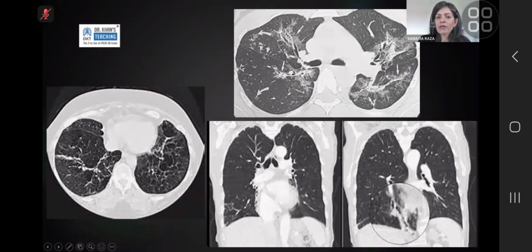So the reason for putting down active changes is the patient still gets treatment. Sometimes, particularly with COVID infections or atypical infection, they can get a bout of steroids, and that can really help improve their symptoms as well as their imaging. And the other factor to look for, obviously, in somebody, this is actually sarcoidosis, is you can look for the fissures or the tree and bud nodules or nodularity. So tree and bud nodules, centrilobular nodules, fissural nodules, they all imply active disease, whether it's inflammatory or infective.